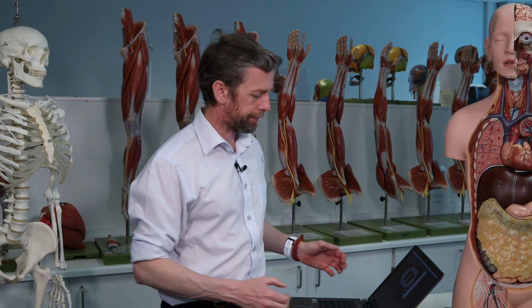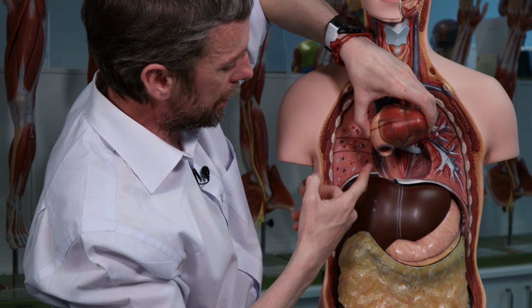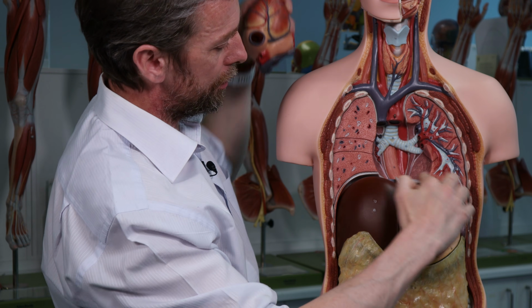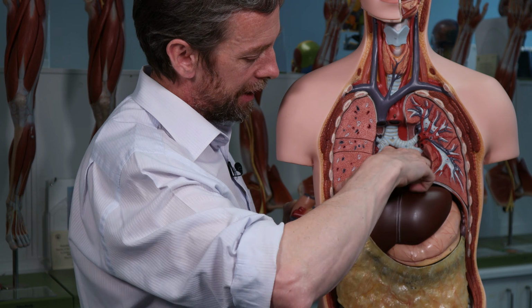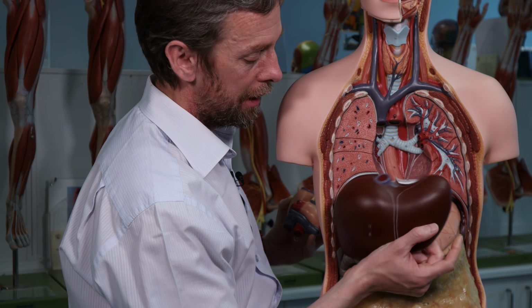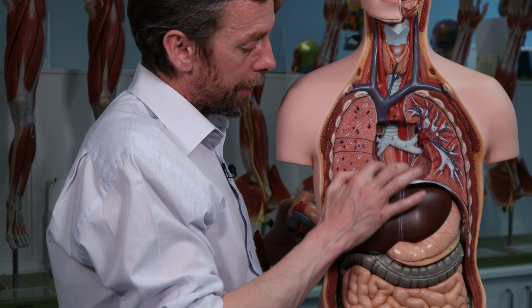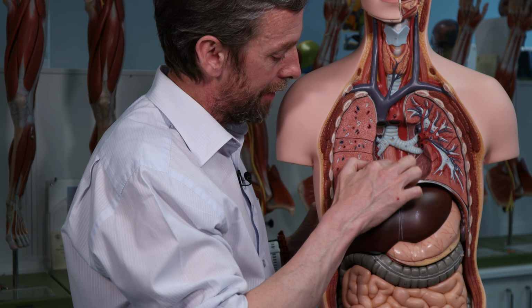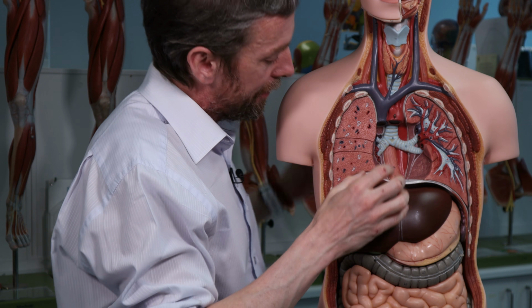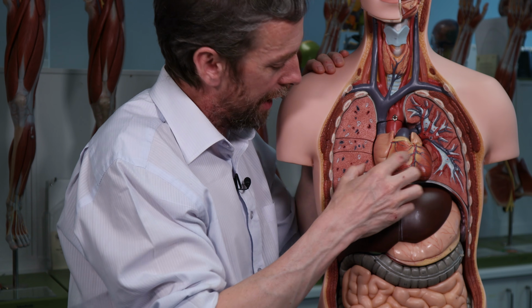And the inferior vena cava. Although remember that the inferior vena cava goes straight into the heart, and the heart is sat on the diaphragm, and the inferior vena cava is passing through the liver. The liver surrounds it, really. So if we're following the inferior vena cava, we go from liver through the diaphragm and then straight into the heart. So we're going to have to be considerate of that.